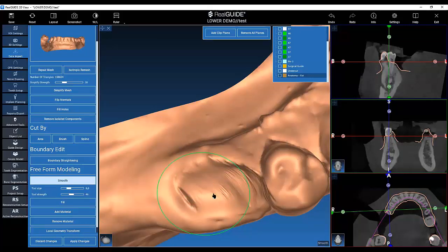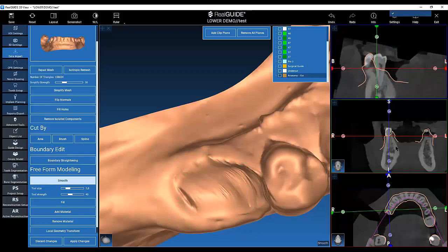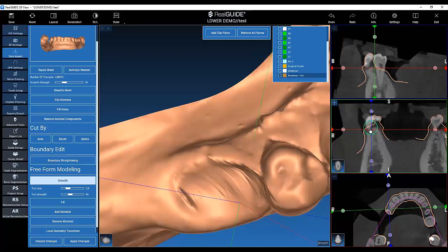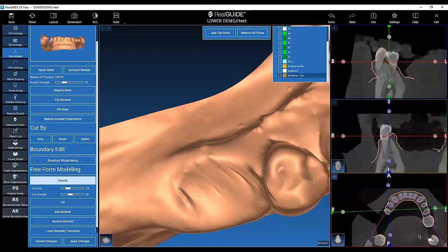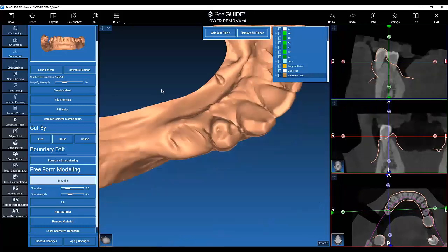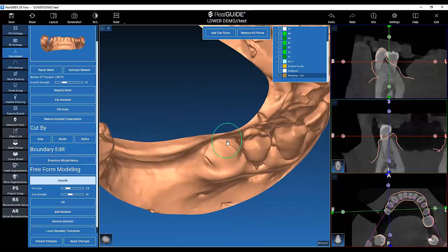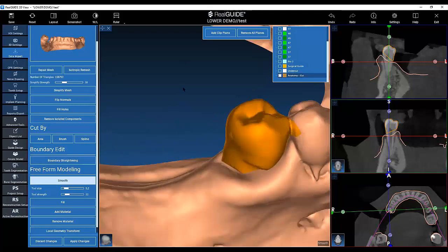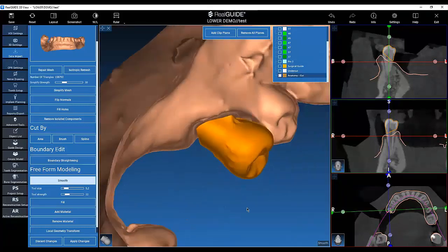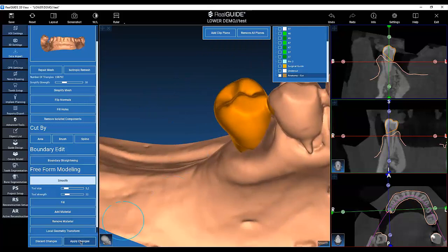And you can do this also on 2D views. You can also work in this view. Both ways are possible. You can work the same in the different views, and all the modifications are real time. So if you do something here, also these images will be updated, and the other way around. So that's the first thing. The object is here, so you can always make it appear from this section. If you want to apply this modification, you just need to click on Apply Changes.